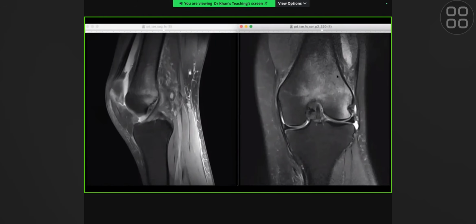So I believe this is in keeping with a direct impaction injury, as opposed to a twisting injury. And you mentioned that the patient's a skier, so I'll be worried about a pivot shift injury, although that's more of a twisting. A pivot shift injury? Yes. Suggest the ACL doesn't look, you've said the ACL looks fine, you've said the menisci look fine, and you haven't said anything negative about the MCL. So how can it be a pivot shift if none of these structures is damaged?